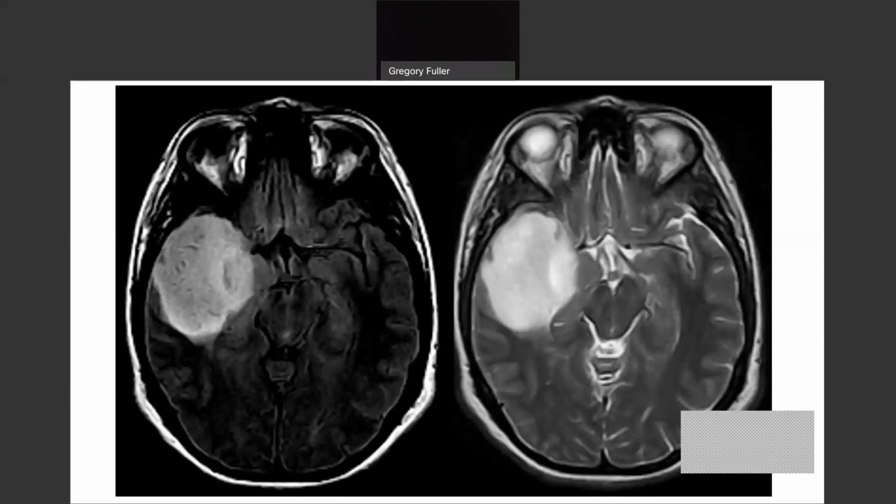And by the way, this is a tissue-proven diffuse astrocytoma, IDH mutant, with a history. I think this one was maybe 5-6 years down the road, and we're looking at a scan way in the past. And if we had known then what we know now, this would have been a slam dunk. Okay, good job, everyone. I'm going to keep presenting this until everyone knows about it.